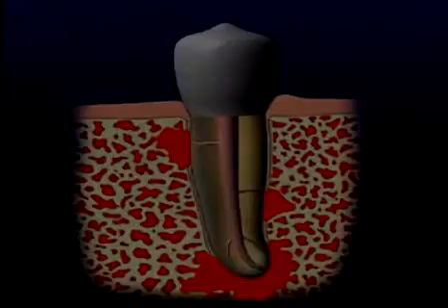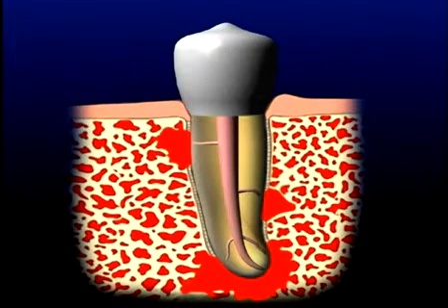In this cleared section analysis, looking at the proximal view of the mesial root of a mandibular molar, we can see a fin, webbing between merging systems, and gutta percha entering into multiple apical portals of exit. We've spoken a lot about the importance of 3-dimensional cleaning, shaping, and obturation, but let's not forget the rest of the seal.